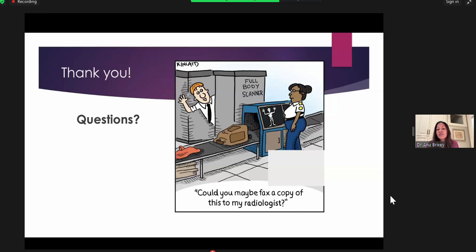So when we look at cavities, we're not necessarily able to say it's due to a specific cause. One of the things when you look at a cavity is, am I dealing with something benign, or something malignant, and by malignant I mean either a cancer or a severe infection? Is it more acute versus chronic? One of the most important things to look at is the actual wall itself. How thick is the wall? And is the wall very nodular? Because that's going to indicate that you might be dealing with an acute process.